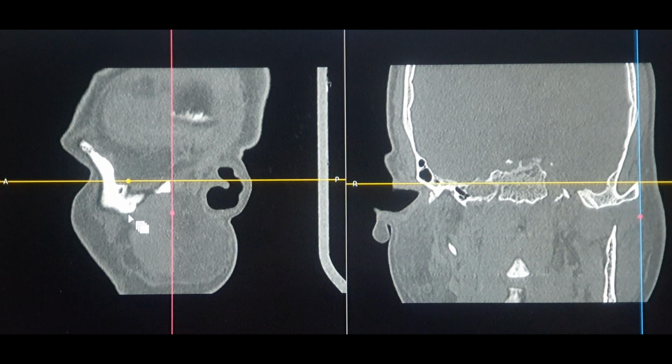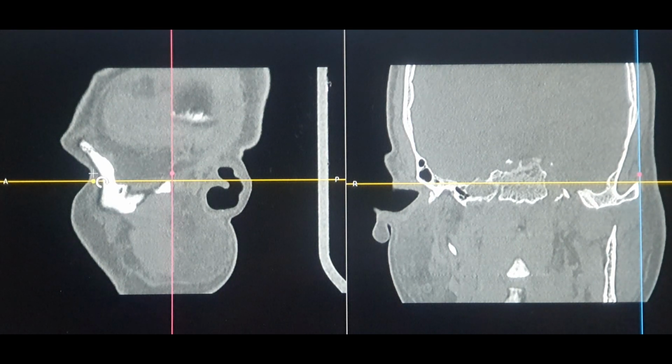So a lot of doubt lies here, in that people get confused as to where to start from, which side is the left and which side is the right in case of reading a sagittal CT scan. Now the first thing is that, as you can see on the coronal section over here, this is the extreme left side, and as you can see, this becomes the patient's extreme left side on the sagittal scan. So the basic thing to remember: if you get a copy of a CT scan, you won't be able to read this with the lines over here.